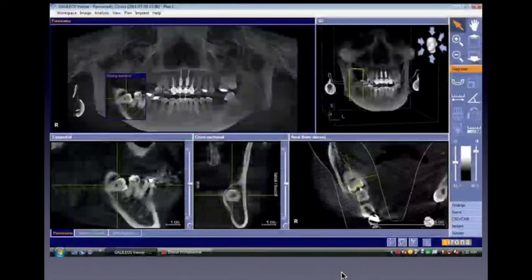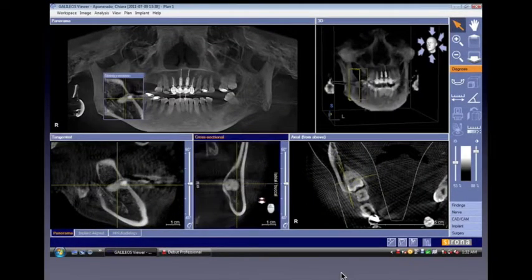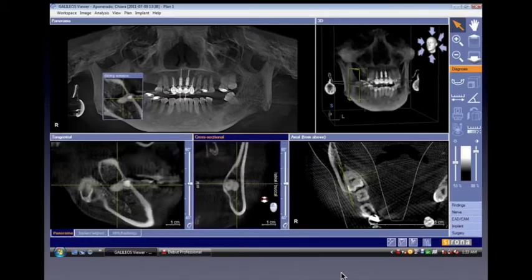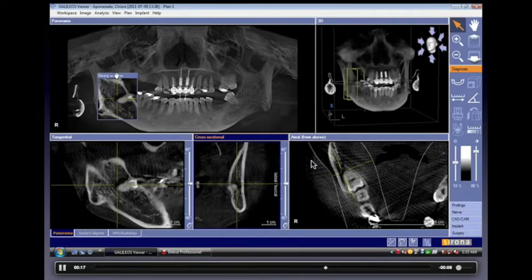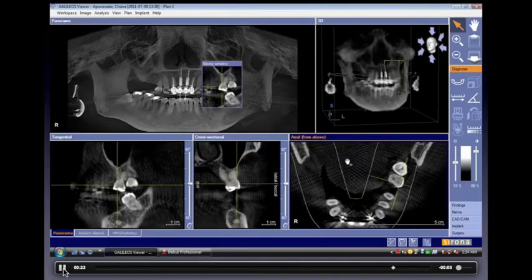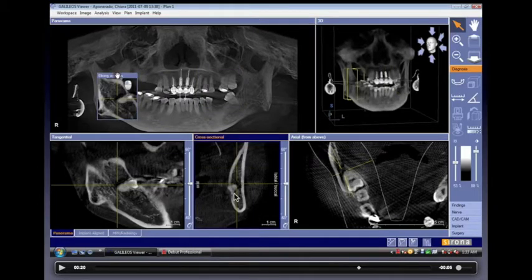Again, here is a screenshot view of the advantage of using CBCTs in assessing pathologies, like in the case of impacted teeth. You now could assess in the comfort of your own home on your computer where the impacted tooth is, how it is projected, where it is in relation to the mandibular canal. Is it on the buccal, lingual? Is it really approximating the canal, and how close is it? So that's what you could see.